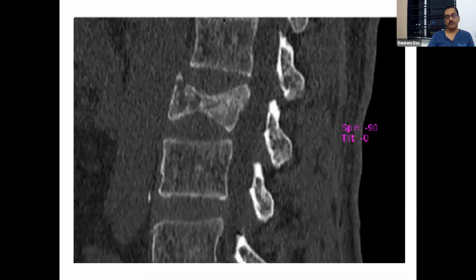Now this is a kind of fracture. These sections are through the middle part. So now I'll be discussing a little about the different types of spine fracture before going to the other part. So here we all remember the Dennis classification of spine fracture, and also the Dennis 3-column concept. Whenever you're talking about spine fracture, you need to remember the 3-column concept.